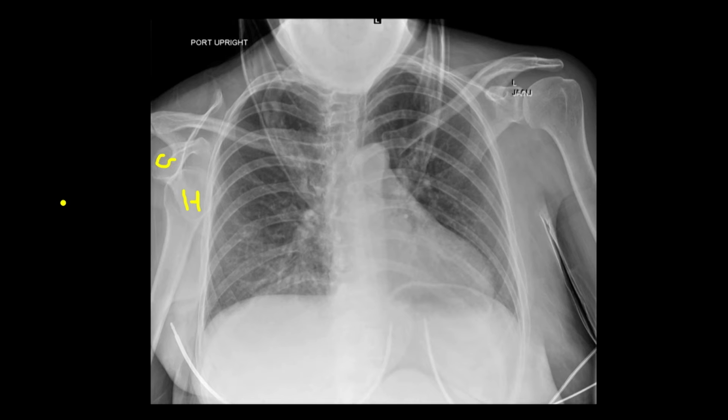And sometimes the patients have other severe injuries. They're not going to be able to tell you that they've got a painful arm. And so it's very easy to overlook injuries that are on the peripheral margin of the film when you're predominantly concentrating on the chest findings. And we're always told we're responsible for every abnormality on the X-ray, not just the ones that we're interested in ordinarily in the thoracic cavity.